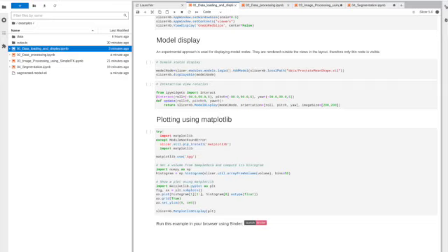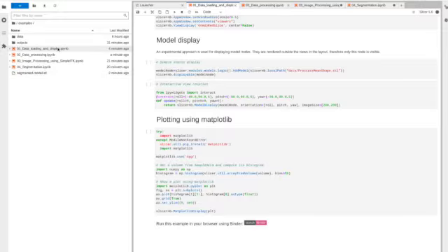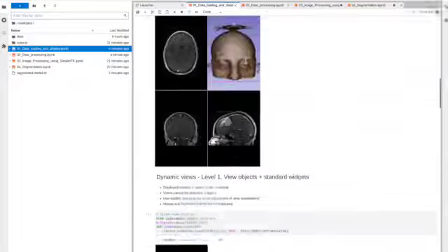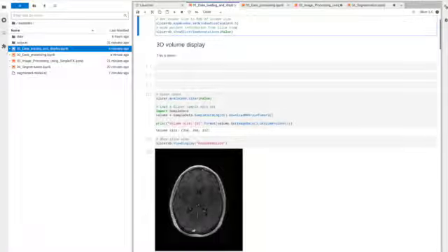Exactly. In fact, they will be there no matter what project you're in. You just start JupyterLab and you'll see those in the example folder. So it'll probably start you in this folder and you'll always have the examples to go back to. In fact, that might be a good way to learn how to use it. You can just copy these and replace the part where it loads the data, which I think is this cell.